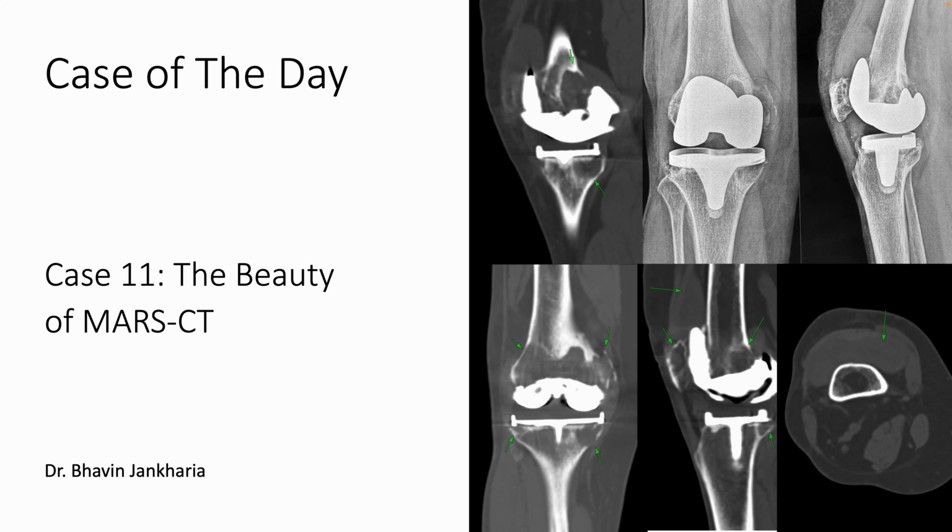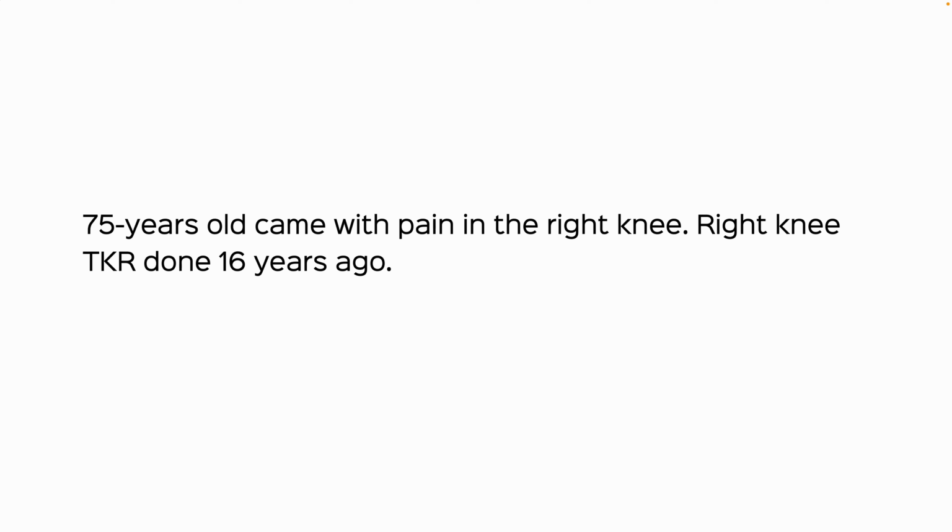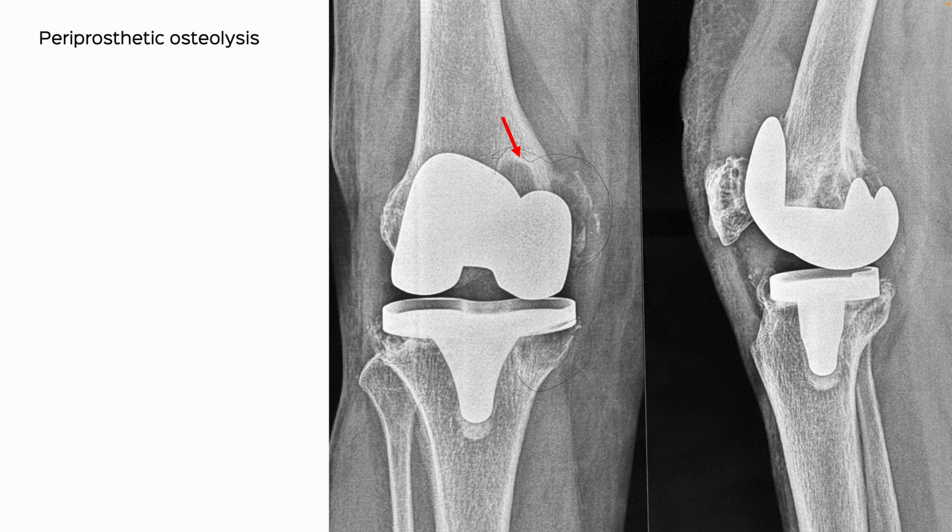That's the 11th case today, the beauty of MARS CT. It's a short one, it just shows us the elegance of this technique. So this patient had TKR 16 years ago and is now for revision. The x-rays are actually quite good.